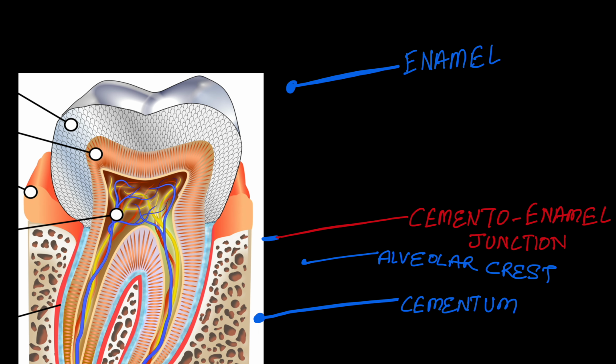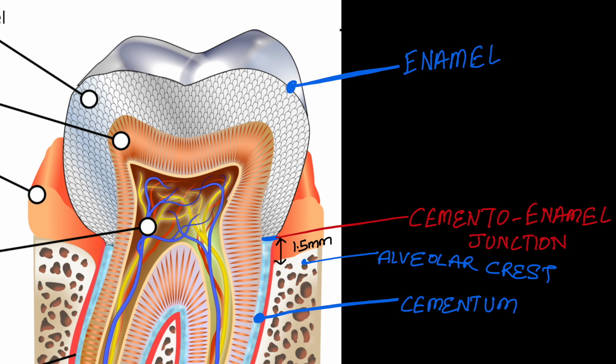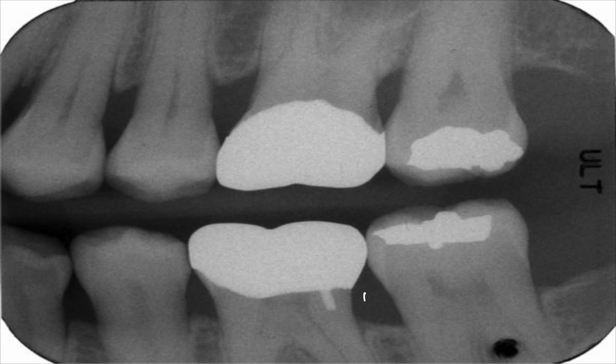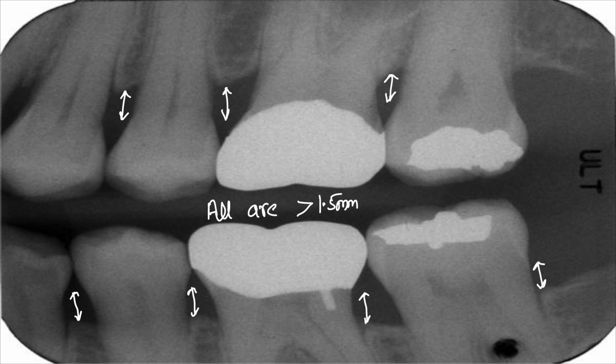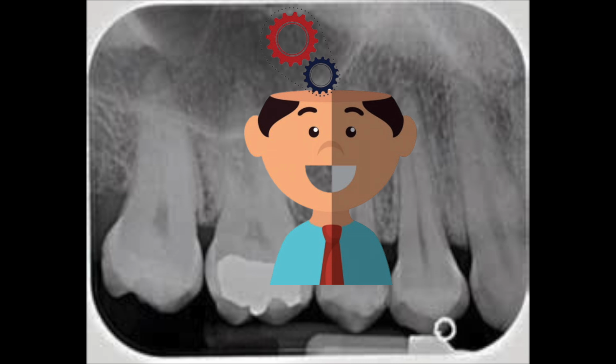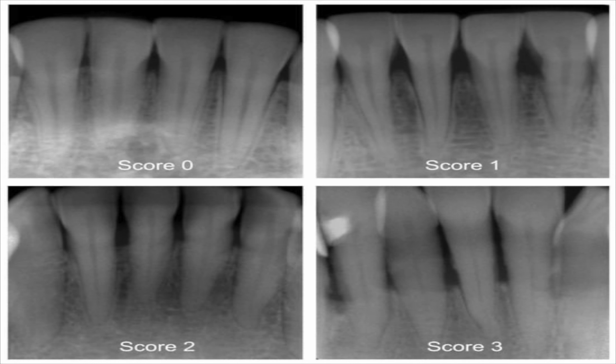So how do we know if the alveolar crest is behaving itself? Well, in an ideal world, it should be no more than 1.5 mm below the cementoenamel junction. That's the meeting point where your tooth's enamel and the root cementum shake hands. Over time, with age or with marked resorption from periodontal disease, the alveolar crest can recede like a slow-motion game of hide-and-seek. Figuring out what the position actually means is a clinical issue, so we have to rely on our skills in the exam room.